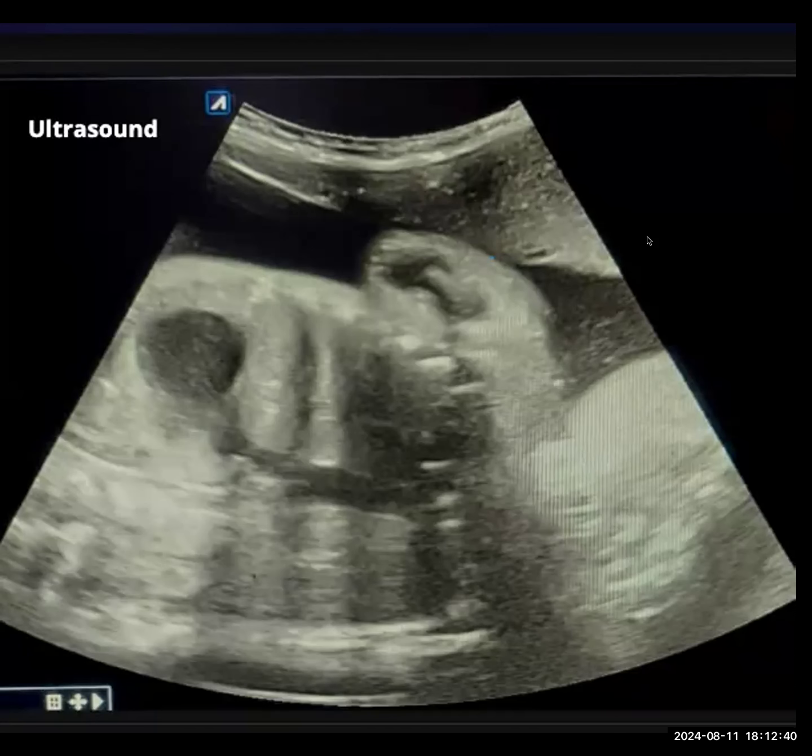It is ending just at the level of the diaphragm, and then there is a branch probably going into this area. So it's a continuous structure? What could you think of? Along this, it could be a renal artery just supplying the pelvis, or this could be aneurysmal dilatation of the branch.